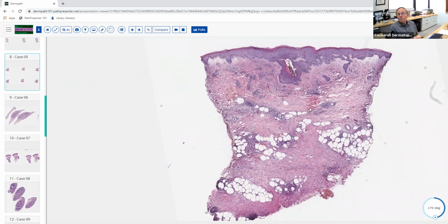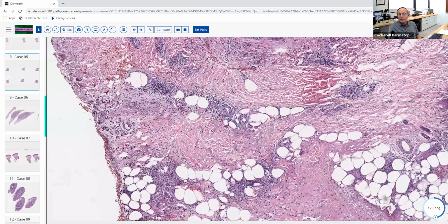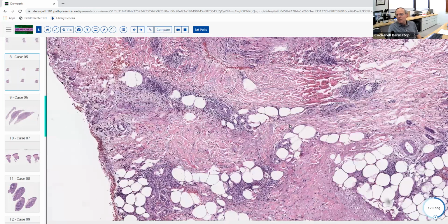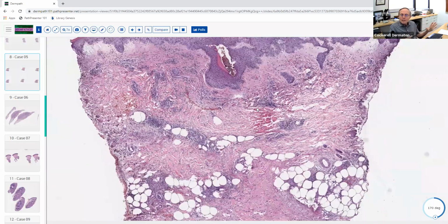If you got strep cellulitis, it used to be called blood poisoning, and they'd often get bacteremia with that because they had no antibiotics, and they would often die. So that was a bad situation in the old days. But today, obviously, we have antibiotics. We can cure this. But this is what a biopsy of that looks like. Sometimes you can get staph cellulitis also. But notice that this gives you more of a diffuse, mostly interstitial pattern, and that's called phlegmonous inflammation.